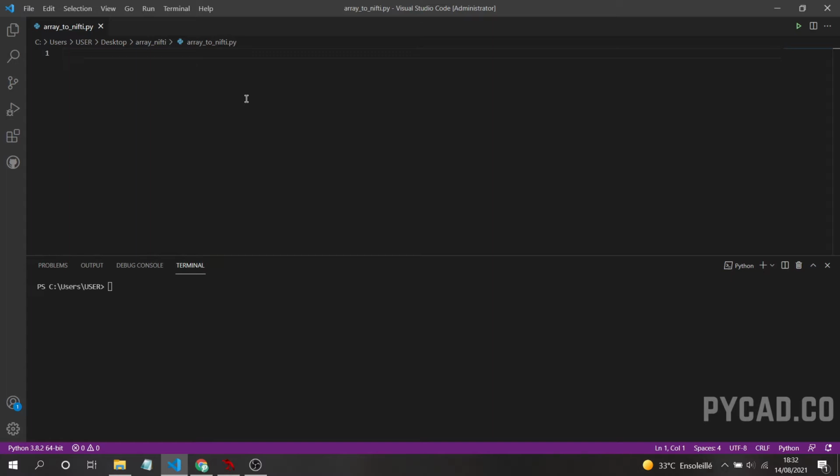3D files. A 3D file is a group of 2D slices which can be DICOMs or any other type of images. So in this video I will show you how to convert a normal array into a 3D volume. This normal array could be a NumPy array or any other type of array, although it can also be a group of JPEG or PNG images, and you put all these 2D slices into one 3D array, then you convert it into Nifti.